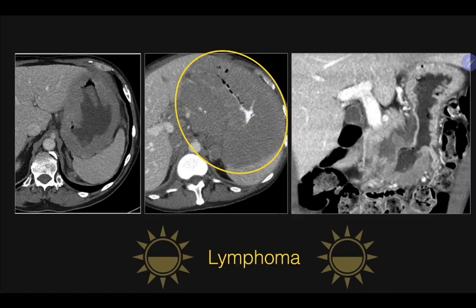This third example is a bit tougher to sort out as there's both tumor and ulceration, but you can start to distinguish the two by noticing the edema along the upper margin flanking some soft tissue here and the larger component of lymphomatous infiltration along the lower margin. So beware of the combination of both tumor and ulceration.